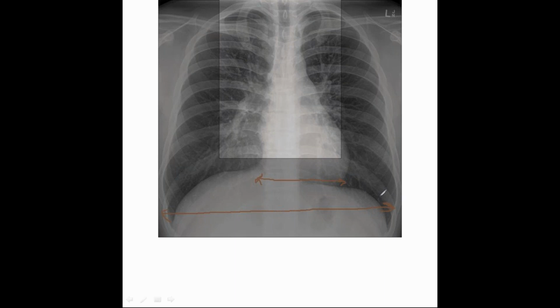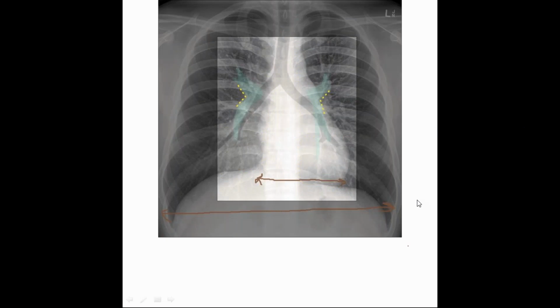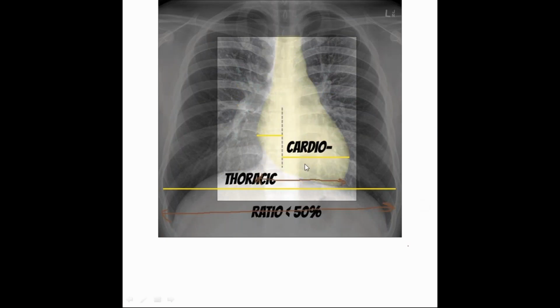However, what one is missing in this is this. In the cardiothoracic ratio, what you have to see is from the midline. If you see, these are the spines which are visible on the vertebra, and if the person does not have scoliosis, you draw an imaginary line down this spine, then you draw one line towards the left extent, and one line towards the right extent.